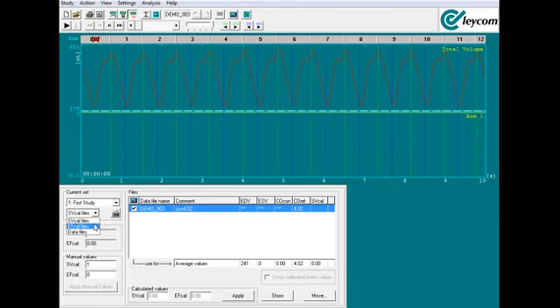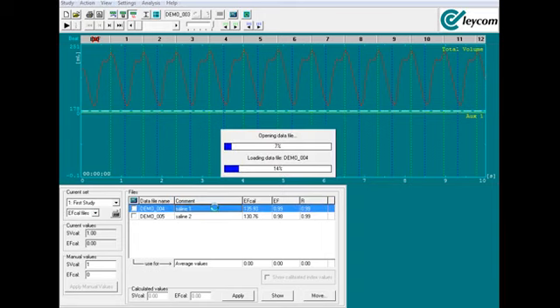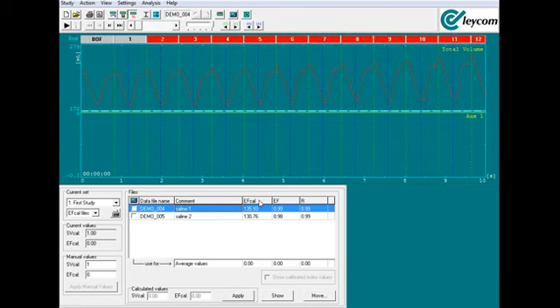Next, we will take a look at our EFCal files, which are our hypertonic saline recordings. By double-clicking on a file, we will see the perceived increase in volume, which is used to determine an EF-cal number. These beats in red are automatically detected, which are the increase of volume determined by the hypertonic saline bolus injection. Notice we have two values, an R and an EF coefficient of regression number. We aim to have a number of at least 0.9 for each value, where R pertains to the end systolic point, or blue line, and the EF number pertains to the end diastolic number, or green line.